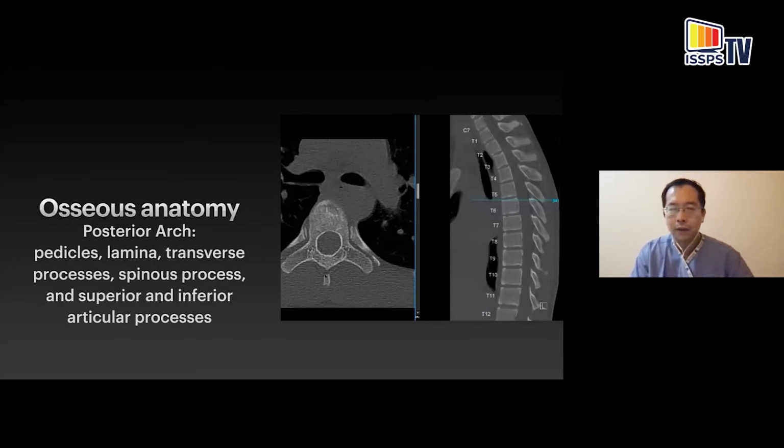And this again reinforces the fact that in the thoracic spine, like the spines of Godzilla, these are very long spinous processes, and they tend to overlap one another to a very large degree, more than you would see in the lumbar spine. And therefore, if you look higher up in T1 to T4, your interspinous space is larger. It then comes down to a very small aperture in the mid-thoracic spine from T5 to T8. And then it starts to fan out slightly again from T9 to T12, eventually forming the lumbar spine.